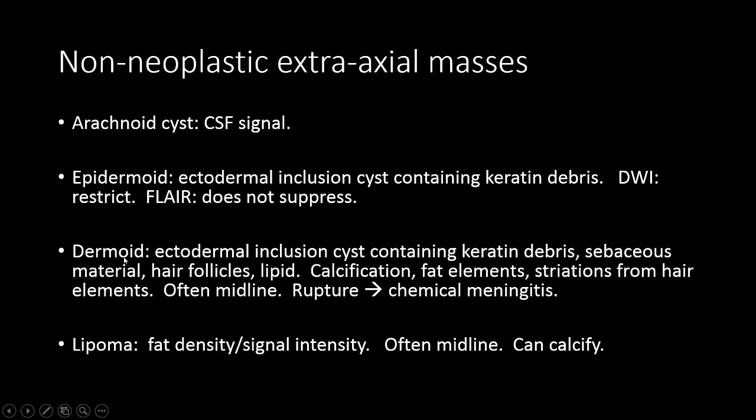Epidermoid and dermoid cysts are both ectodermal inclusion cysts. Epidermoids contain keratin debris and show restricted diffusion on the DWI sequence. On FLAIR, they should not suppress, like CSF does suppress. So that's how you differentiate epidermoids from arachnoid cysts.